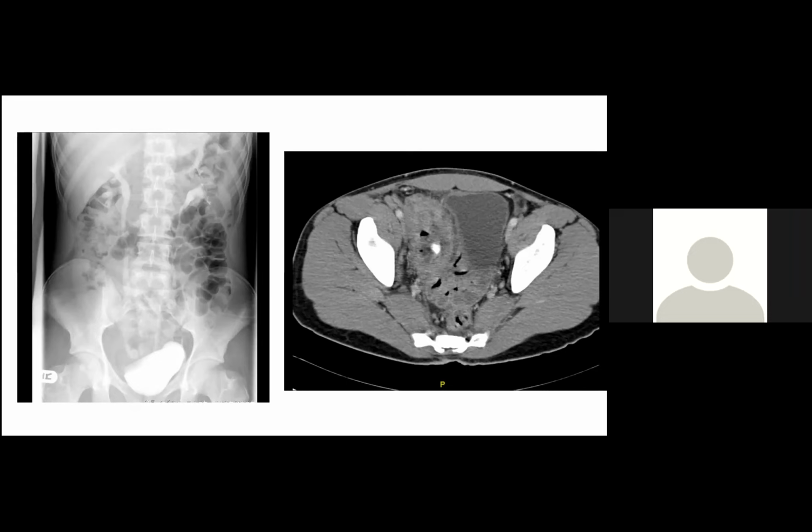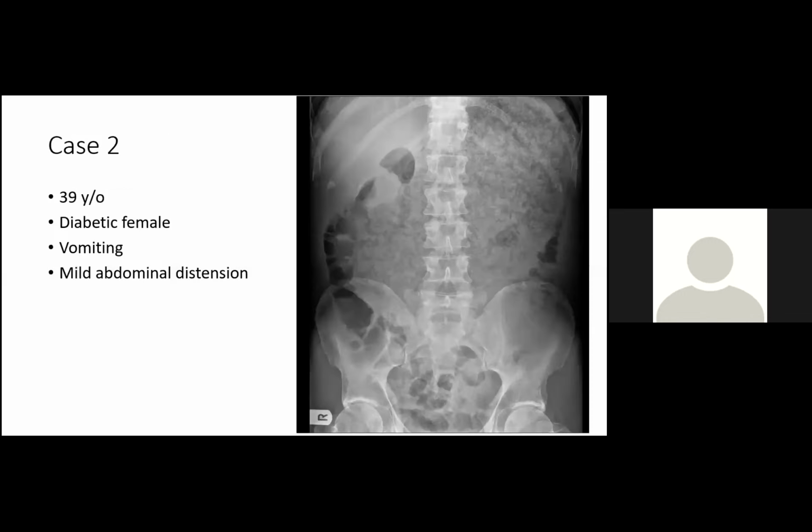Okay, so this is a case of what was an inappropriate use of abdominal X-ray in a young patient where the sequence should have been ultrasound scan first. And I think CT scan following ultrasound, that was okay. Obviously with young patients, we do try to avoid CT scan because of the risks of ionizing radiation, but certainly where there's significant clinical concern, there is a role for performing CT scan because it is quite good at pinpointing the source of the problem in surgical patients. So that was case number one.